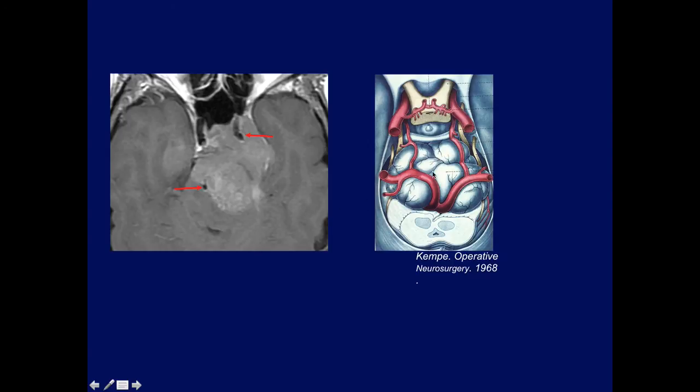And you can see here on this beautiful anatomic illustration, here's a retroclival lesion stretching the PCOMs, displacing the basilar artery back. And we can see on our case here, again, the encased carotid, and here's the basilar artery pushed laterally and way posteriorly.